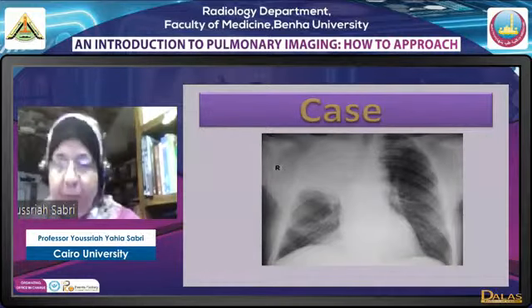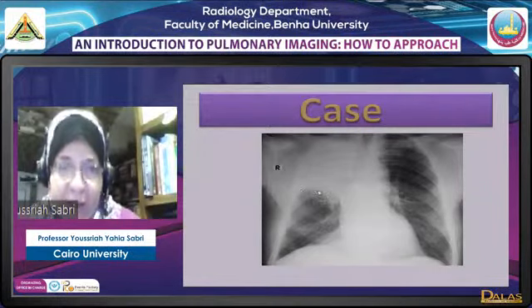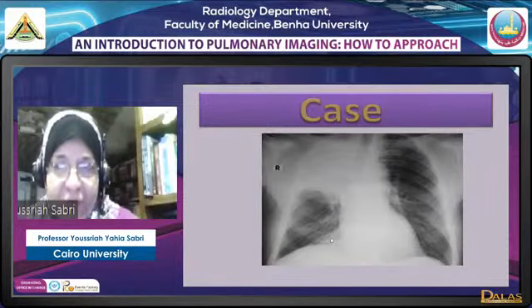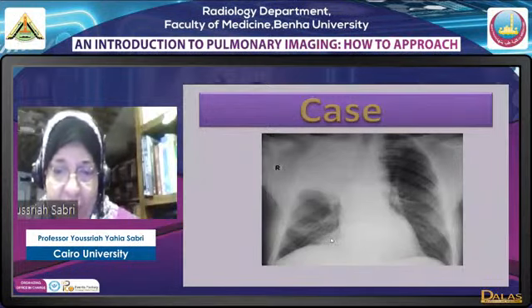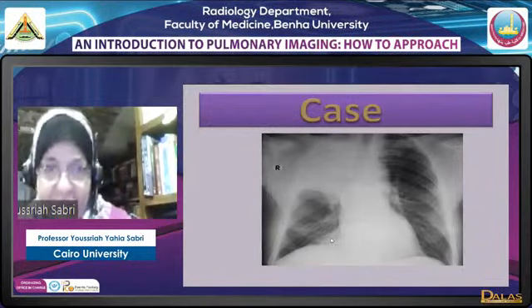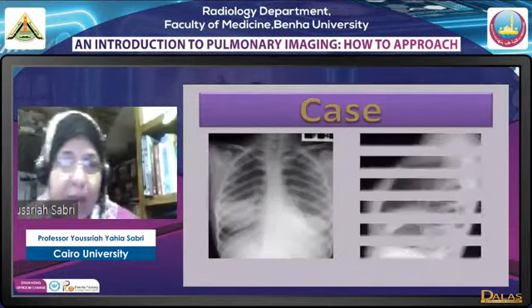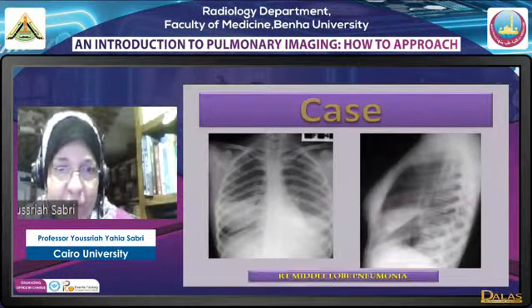This is an upper lobe opacity, but now we have the minor fissure here appearing as a straight line. We have linear, lower linear well definition of the lesion. This means that there is no shift of the fissure, meaning that actually no volume loss. This is a consolidation of the upper lobe. Again, a lobar consolidation is most likely pneumonia. This is a middle lobe consolidation, middle lobe pneumonia, and we have described it before.